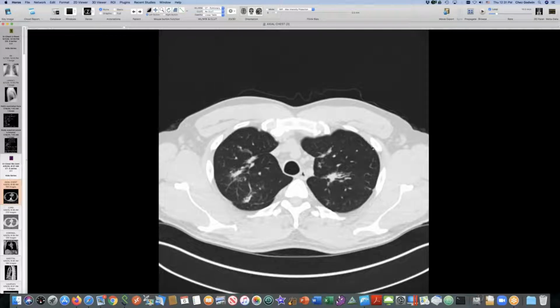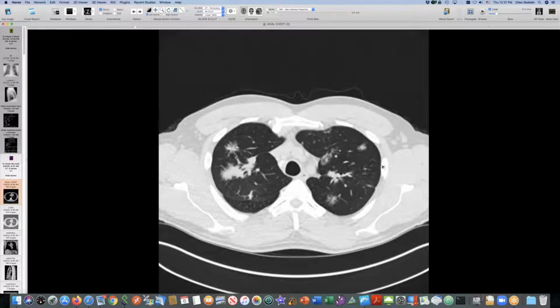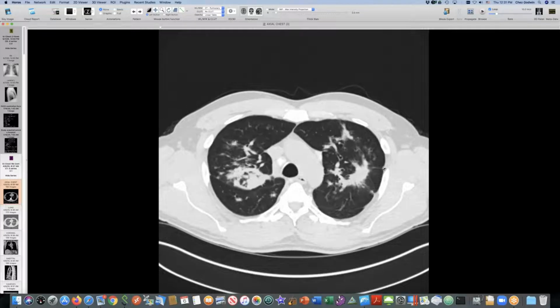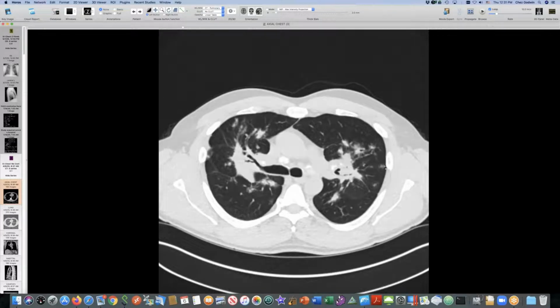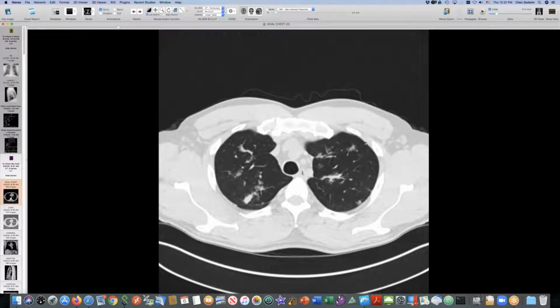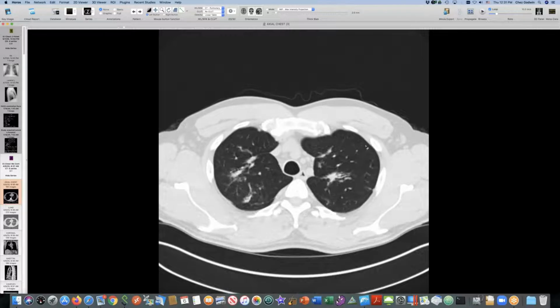So the most dramatic subpleural deposits occurred in coal workers, and it's probably the silica that was mixed in with the coal there. And she talked about high attenuating masses. I think she was really talking about soft tissue attenuation. In other cases, she had calcification.